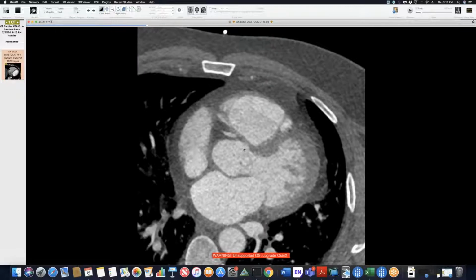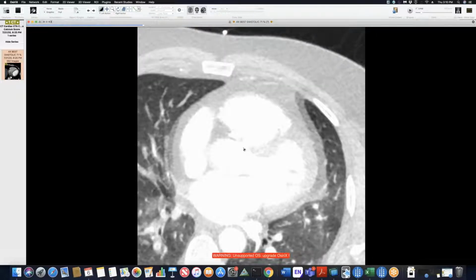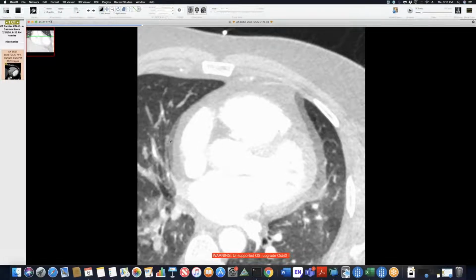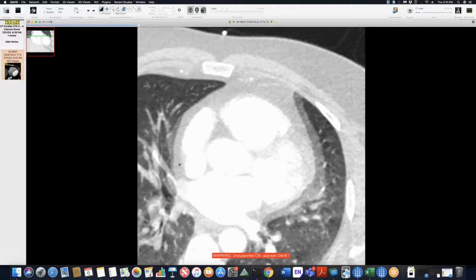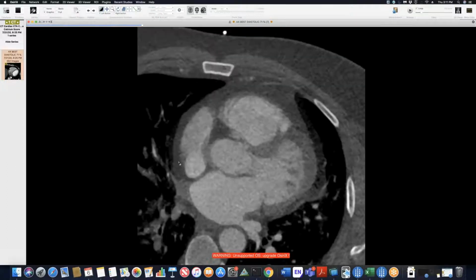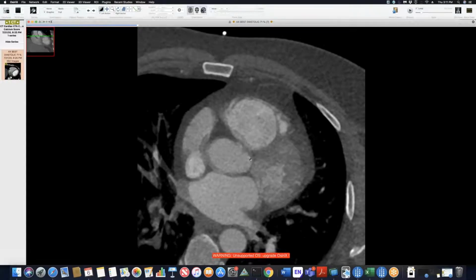And so when I look back at this study, you can go back to the root here, and you put it on lung windows. You can see right at this key image, there's not a whole lot of motion on the scan, but right at the aortic root, you can see misregistration and ghosting right there. There's probably at least one irregular heartbeat there, and that can just throw off the whole diagnosis. So just a good example of a fake out. But this was nonetheless an anomalous coronary, coming between the great vessels, but from the left cusp, not the right.